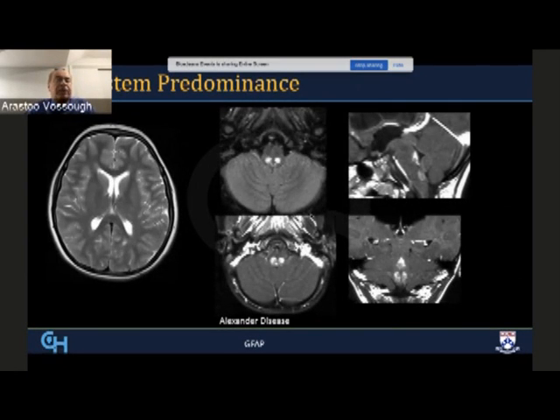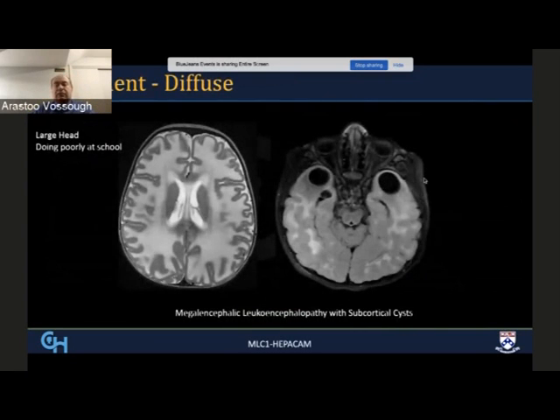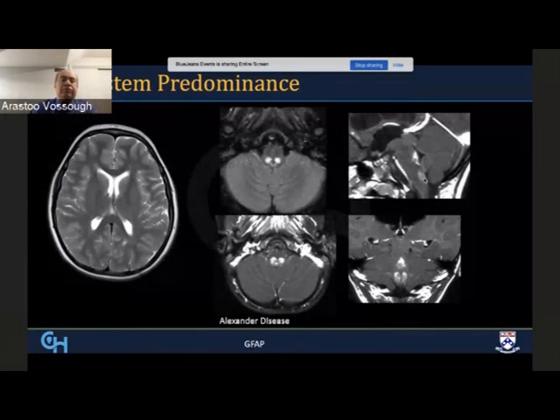And this is another patient, older, presenting with Alexander's disease. You can see very little supratentorial involvement, but we see the brainstem abnormalities and the contrast enhancement. This is the dorsal brainstem. As you can imagine, this patient presented with a lot of vomiting. This is the so-called type 2 or juvenile or adult form, although there's overlap between those as well.